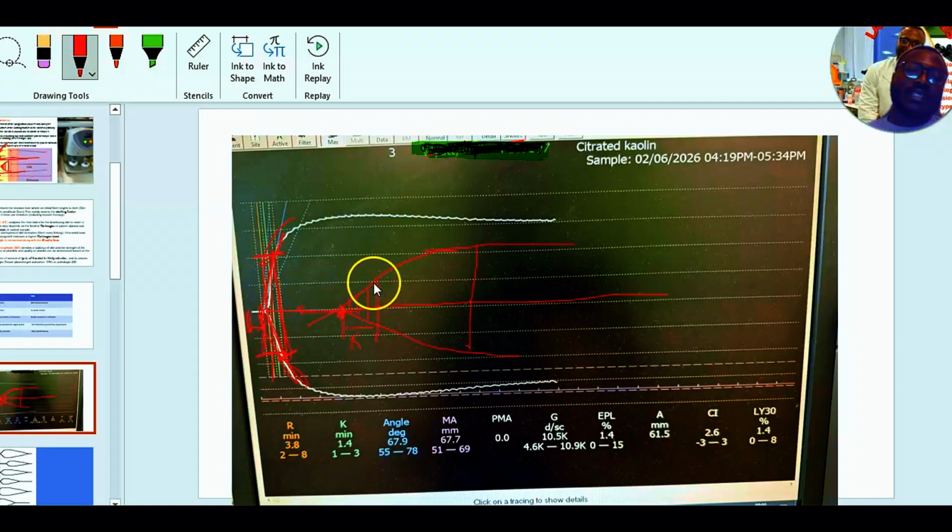But look at this side. If you draw a tangent here, the angle it will form with the horizontal axis is very small. That is the alpha. The reason is because the fibrinogen did not trap quickly. There was low speed of fibrinogen activity trapping platelets, unlike this side, that all of a sudden it became so wide at the bottom that the angle here was so big.